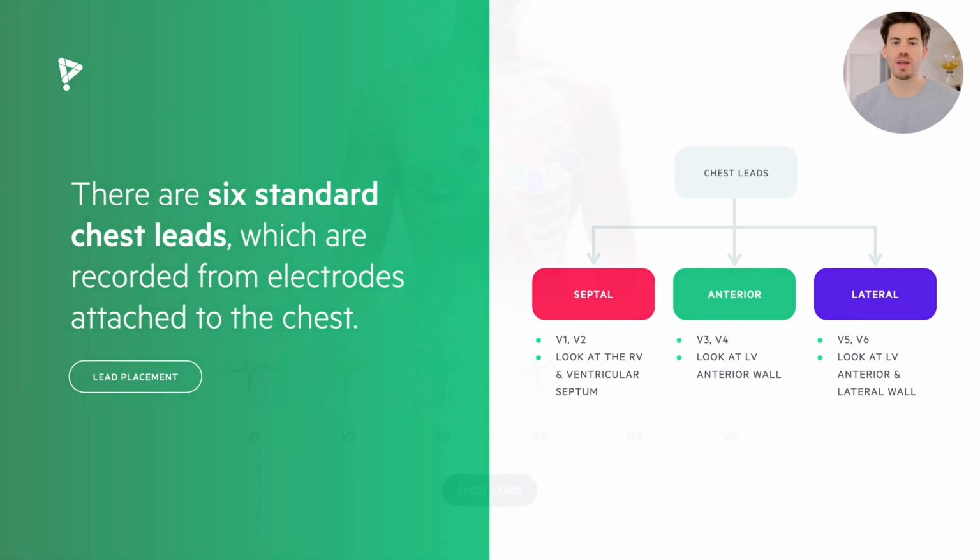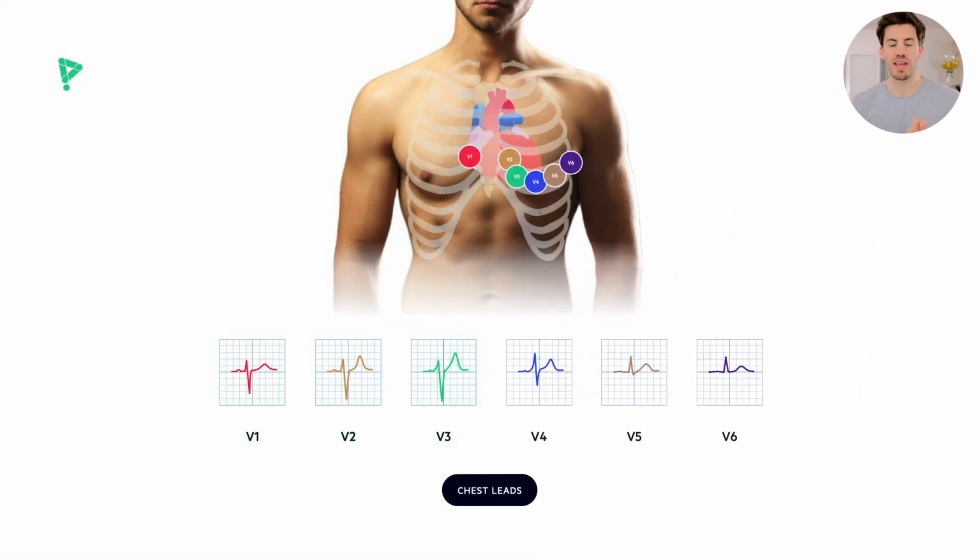And we can look at these in closer detail. So we have our 6 chest leads across the chest wall. And again, it just gives us a different representation of that electrical activity because we're viewing the electrical activity going through the heart from different positions. So if you compare V1 to V6, they look like different complexes because we're viewing that depolarization wave through the heart in different positions. And what you can see is that V1, V2, and V3 are all predominantly negative.